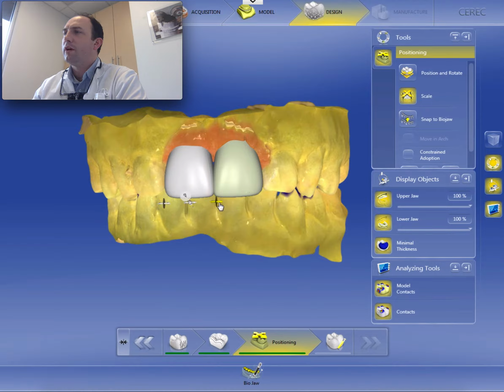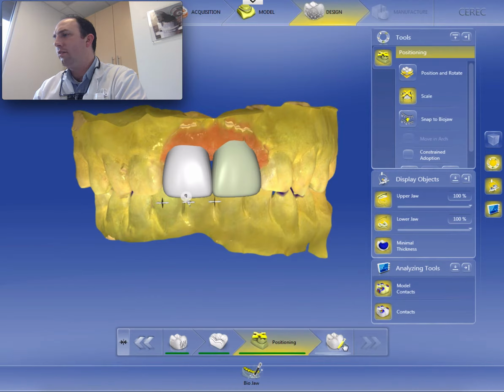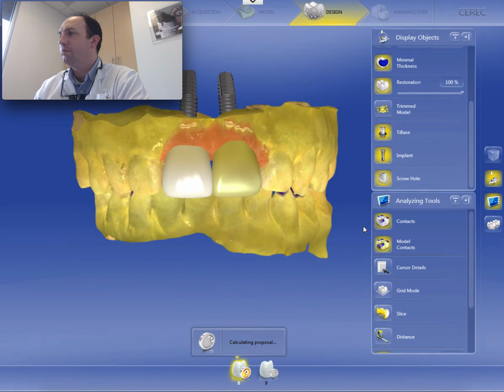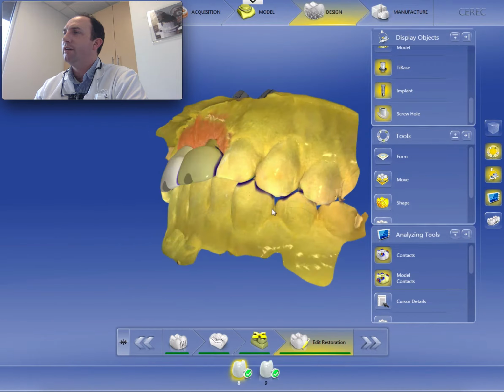Let's pull this one back just a little bit. There we go. Okay, so I've deselected this. I'm going to go ahead and hit the calculate, and it's going to recalculate those. And hopefully we'll get a little better proposals than we got just a minute ago. Not so much. Yep, not so much. So we got our work cut out for us.